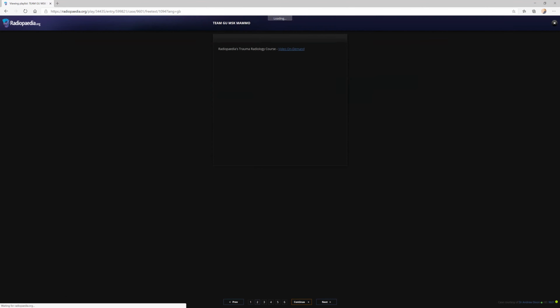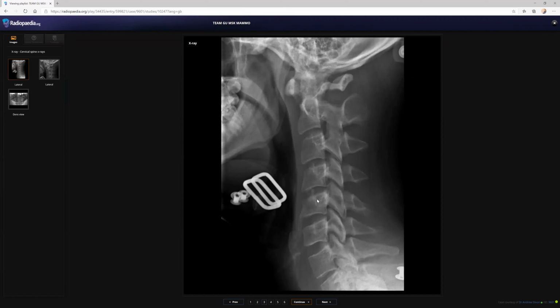Okay. So here, this was a cervical spine. Your approach was good. You said you will be looking at the anterior spinal line, posterior spinal line, spinolaminar line, and also the prevertebral shadows and any widening. And you correctly pointed out that the atlantoaxial distance is widened. Normally in an adult it is less than 3 millimeters, so it is obviously enlarged.